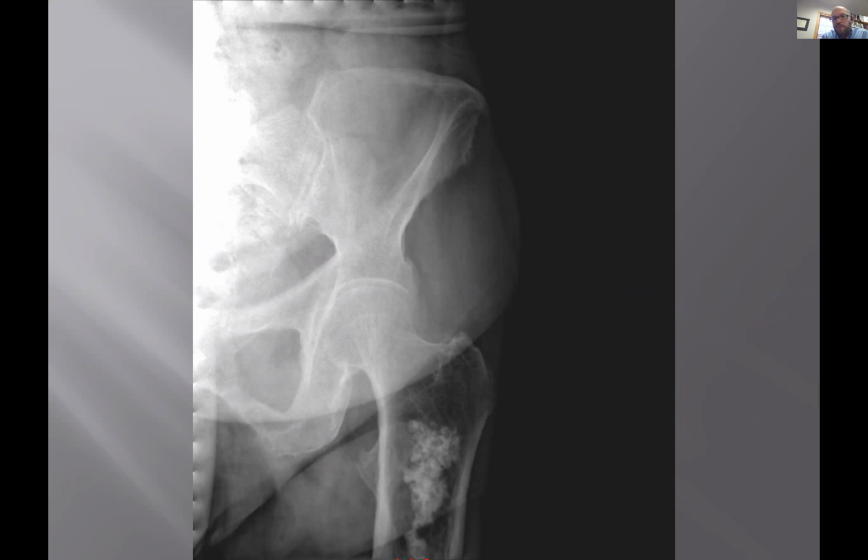So with kind of central calcifications, here I don't see cortical breakthrough. I don't see cortical breakthrough. In fact, I'm looking for endosteal scalloping like I saw in that thumb, thinning and digging into that cortex. It doesn't really look like much of that. So what would be your differential on a case like this?